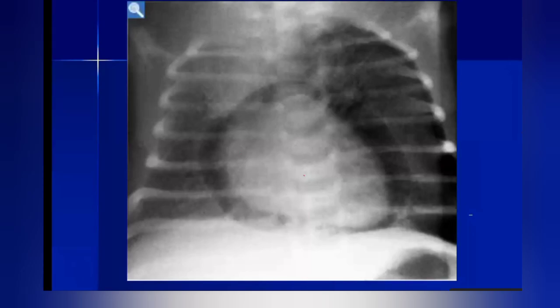It could be due to barotrauma, positive pressure ventilation, trauma like penetrating trauma, very rarely due to gas forming agents causing pericarditis, but it could be seen in patients with positive pressure ventilation or post positive pressure ventilation.